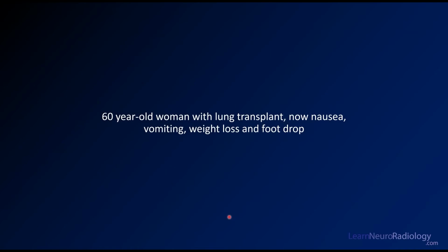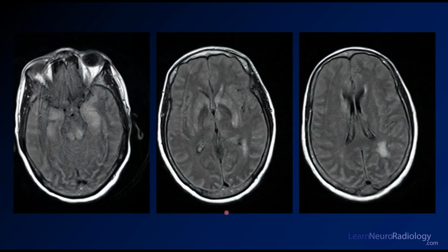Our next case is a 60-year-old woman, status post lung transplant, now having nausea, vomiting, weight loss, and foot drop. Here, similar to the other cases, you see these patchy white matter abnormalities. This is all FLAIR. You see the hippocampi are not normal here. The dorsal midbrain is not normal. Patchy white matter abnormalities here, again in the periventricular white matter.